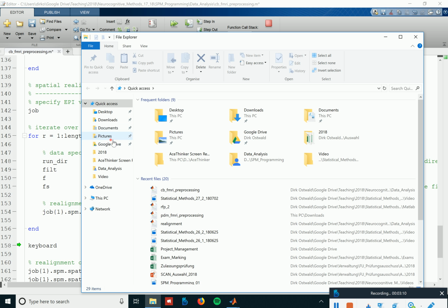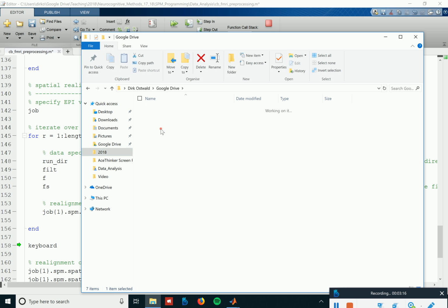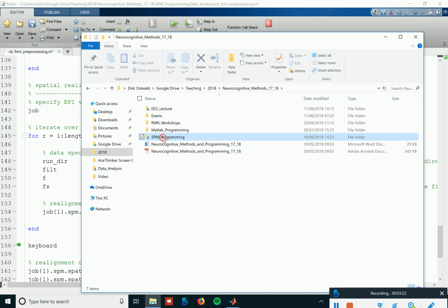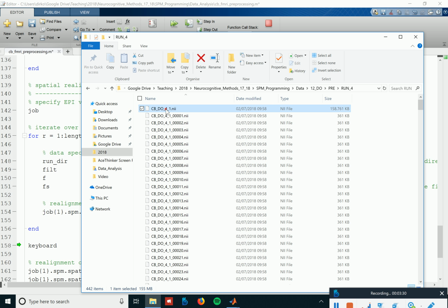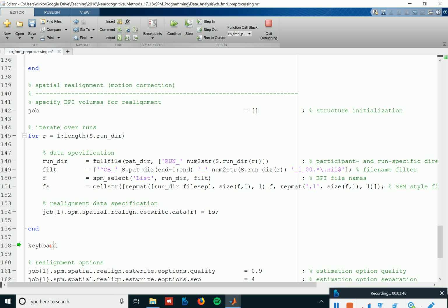So this makes sure that we only get the files we're interested in and not the other one. So this one we don't want. That was our 4D file, and we're looking for those that have like this 100. And these are all our NIfTI files of interest until 444. And then actually I just ran the code up to here.